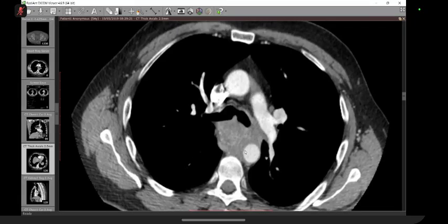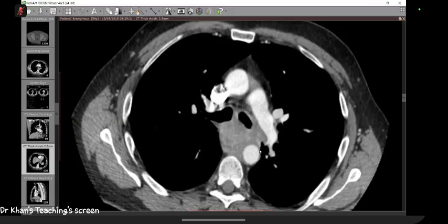What do you think is happening to the aorta? Completely encased. Now you can see this triangle of fat. It is gone between the aorta and this. And then you can see this soft tissue which is going, one can argue that it is maybe 180 plus degree. So anything more than 90 is definite, right? So this is aorta.